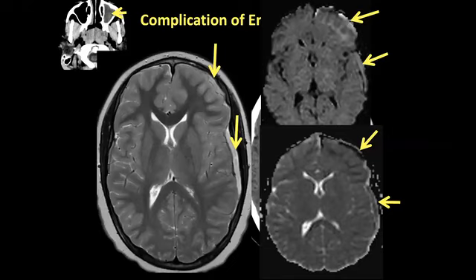This is a patient who had acute sinusitis and presented with focal signs and a decreased level of consciousness. And the sinusitis was complicated by an empyema. In this case, it may not progress, but if it does progress, it can progress to a cerebral abscess because it's going to spread via those cortical vessels into the adjacent perivascular space and into the brain parenchyma.